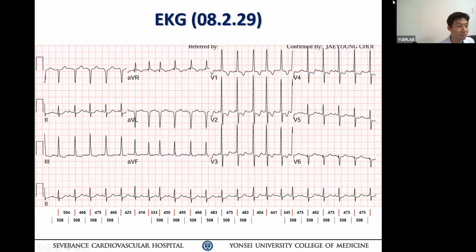Okay, good. So somebody discussed dextrocardia versus situs inversus. If this is situs inversus, your P wave axis should be abnormal. The P axis is pretty much normal. So probably this is underlying sinus rhythm or sinus tachycardia; for a baby, the normal heart rate depends on age. Heart rate is only about 110, 105. Okay. Second point is that clearly you have more V than A. So this is ventricular tachycardia.